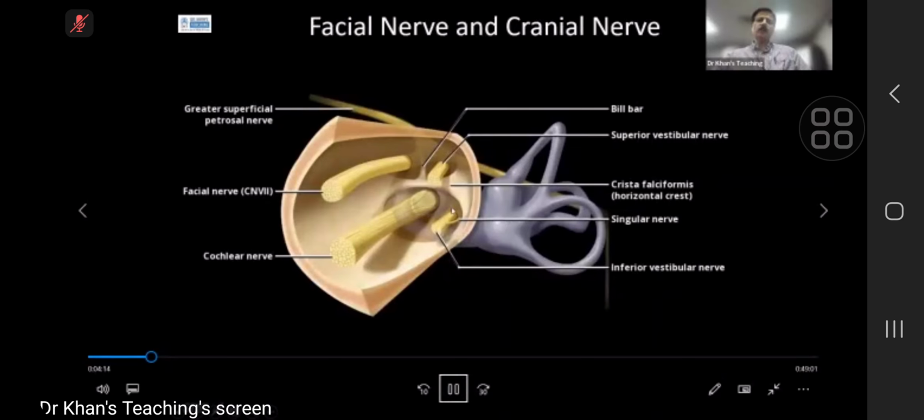Now, this is a potential exam scenario where, because we can see it on an MR, and we can see it on a sagittal sequence of MR. Within the lateralmost part of the internal auditory canal, actually there are 4 nerves. And as I was telling you, they can be seen on an MR, and this has been asked in the examination. There are 4 nerves.